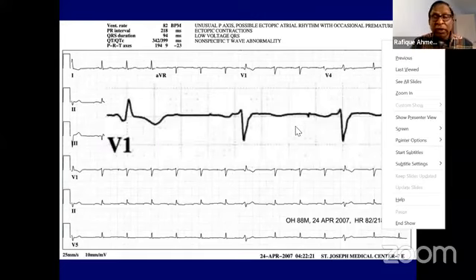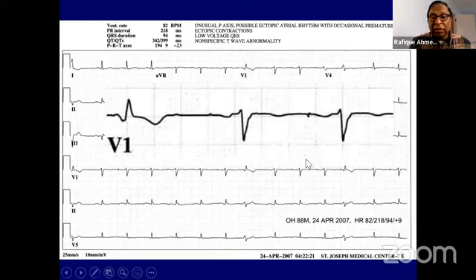And if you have doubt, then you look at the clinical history of the patient. Look, by the way, does this patient have a pacemaker? There is no magic wand to find out this ECG. A lot of times I just investigate. I see something, I think it is a pacing spike. And the other thing is, can it be an artifact? If it is an artifact, it will not be present in every QRS complex. So you can see where my pointer is. There is a pacing spike. There is a tiny one here and a tiny one here. So it has to be consistent. Otherwise, it can sometimes be artifact.